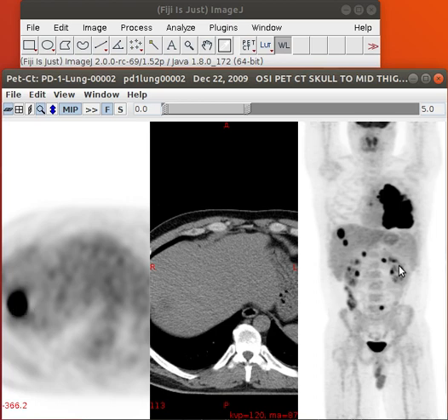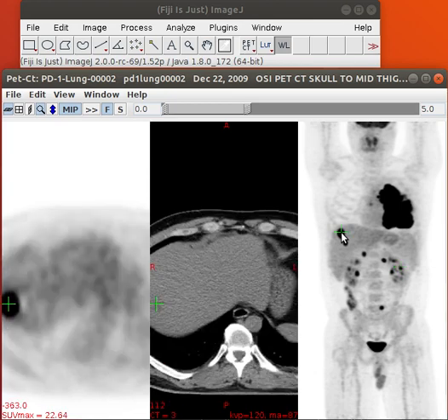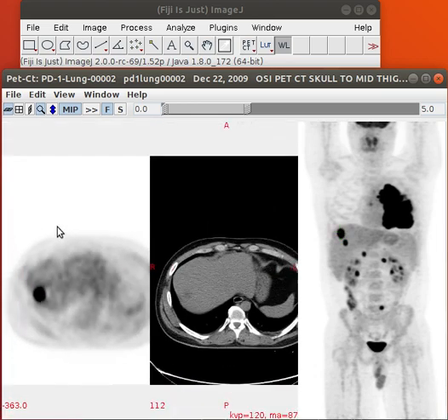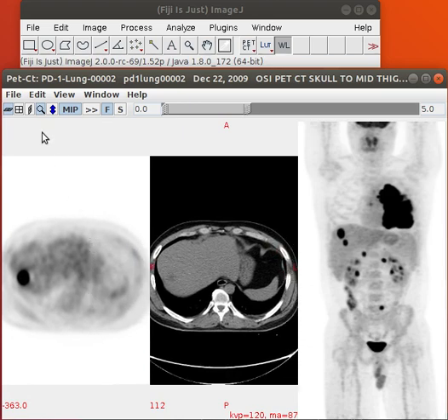If I click on the kidney, you can see that the pan is shifted such that the tumor is guaranteed to be in view. And in this case, the tumor is out of view. If I click on it, it pans it such that it's in view. Okay, so it's guaranteed to be in view. Let me take a somewhat smaller zoom because I don't generally need to have this thing completely in. Now I'll unclick the zoom button such that I can no longer pan this.